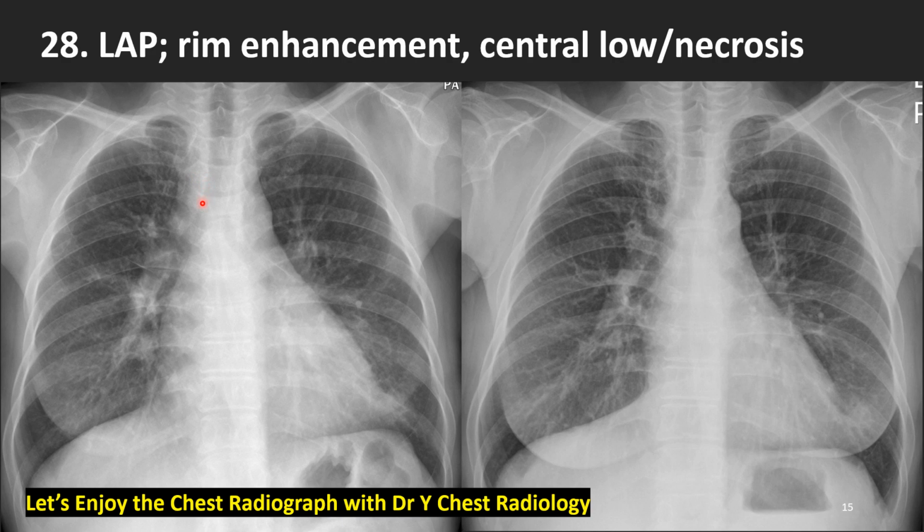Paratracheal obliteration, AP window lymph node, hilar enlargement, interlobar lymph node enlargement, and also in the peripheral lung field, we see many innumerable micronodules, miliary nodules, all gone after treatment like this. Let's find out in the CT.